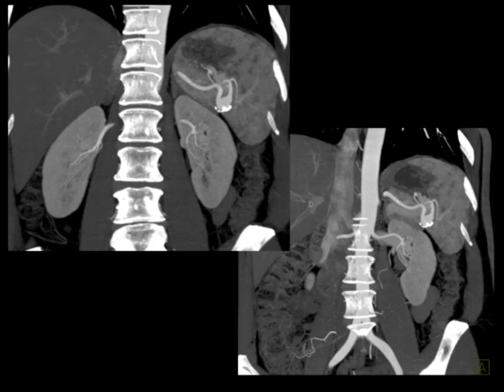Well, here's a great example of a patient referred in for a pancreatic mass that was felt to be a neuroendocrine tumor of the pancreatic tail. You can see an enhancing lesion with rim calcifications, and if you think about it for a second, you realize you're not dealing with a pancreatic mass, you're dealing with a vascular lesion, a pancreatic pseudolesion, I would call it. It's a splenic artery aneurysm pushing on the tail of the pancreas.